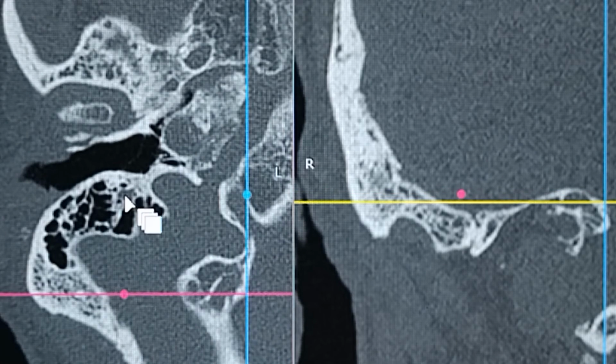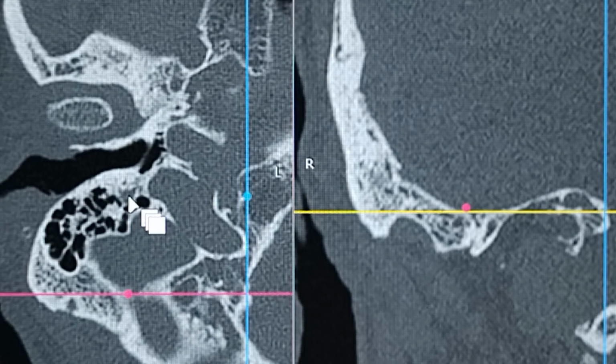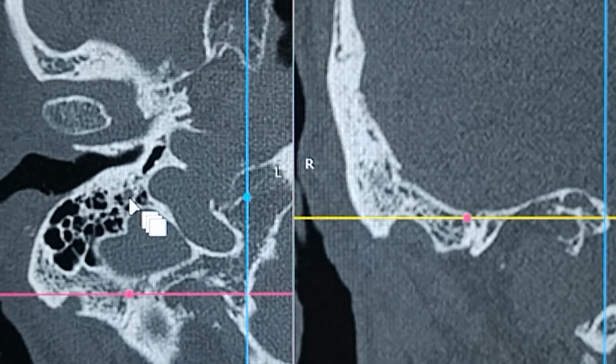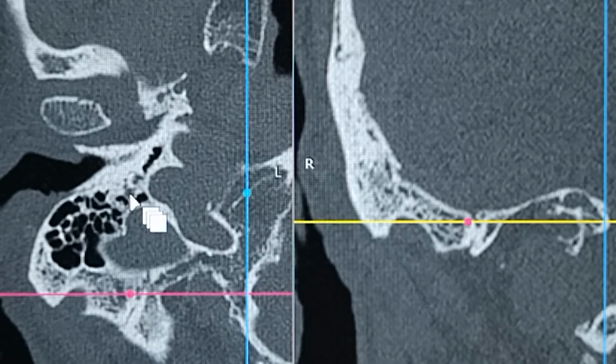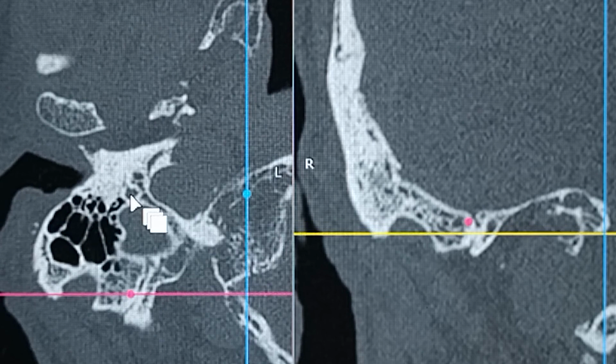Eventually, once the stylomastoid foramen is achieved, you're going to see that nerve exiting outside. This is the facial nerve right there, and I'm going downwards. That's the carotid artery, that's the IJV, that's the facial nerve right there in the mastoid segment, vertical part. And then you can see it becoming very faint right now. Now that's the facial nerve.